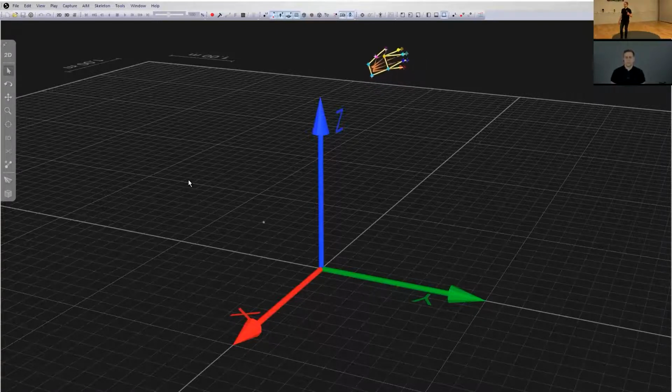What this does is that it basically has a skeleton definition, where the skeleton are those orange triangles that you can see. And it can be controlled for all the fingers individually. So if you are interested in finger tracking, you now have a method built into the QTM software directly to apply finger tracking. All of these segments are tracked in 3 dimensions, obviously with some constraints to be able to actually track them in 3 dimensions. But if you're interested in any angles here, you can do some basic computations and get some basic outputs directly from the QTM software.